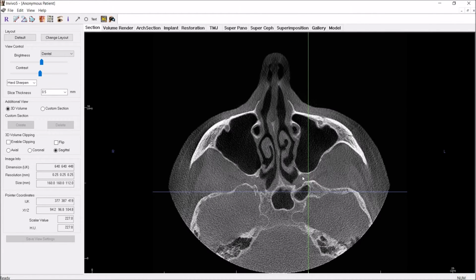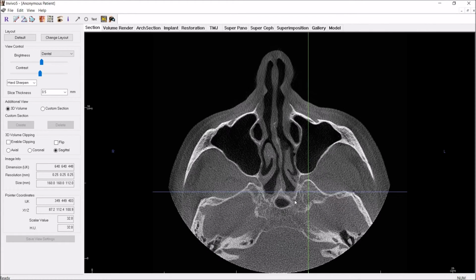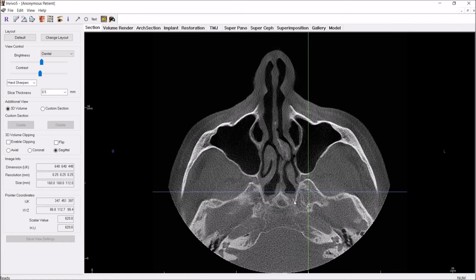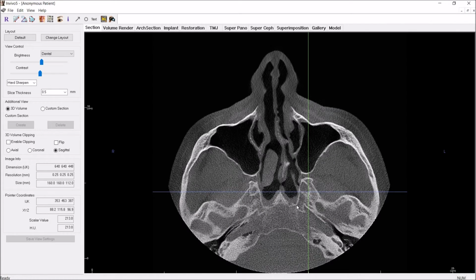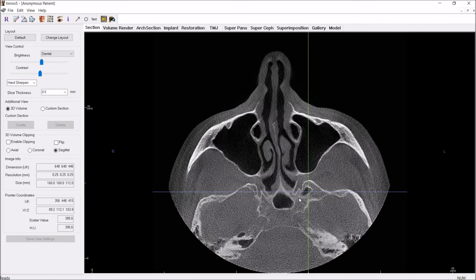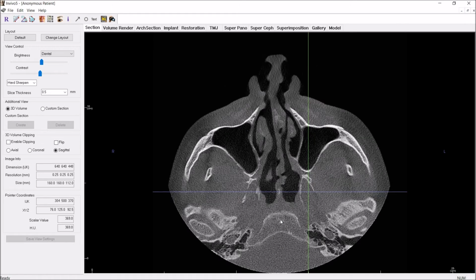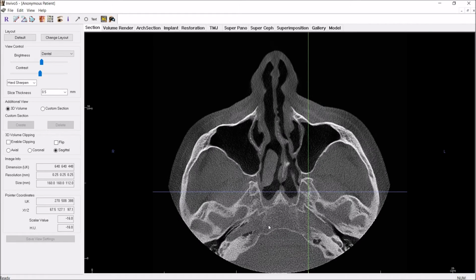But sometimes that pterygopalatine fossa will just kind of extend posteriorly, and as you follow this, it doesn't really go anywhere. It's not a real canal. It's not pathology. That was just a little interesting variation. But again, I think things like that should catch your eye. You should be accounting for the normal anatomy.